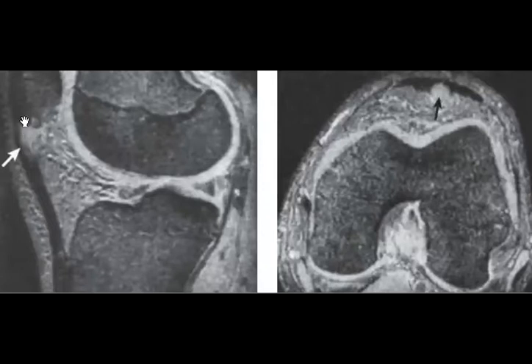pole. So you can see sometimes there is maybe some edema or bony irregularity at the lower pole of the patella, associated with edema and high signal of the tendinopathy. So tendinosis or tendinopathy of the tendon, then you will ask the patient if he does any sports. This patient is a basketball player, so you will find the typical history. Then you are going to mention that it will be the jumper's knee.